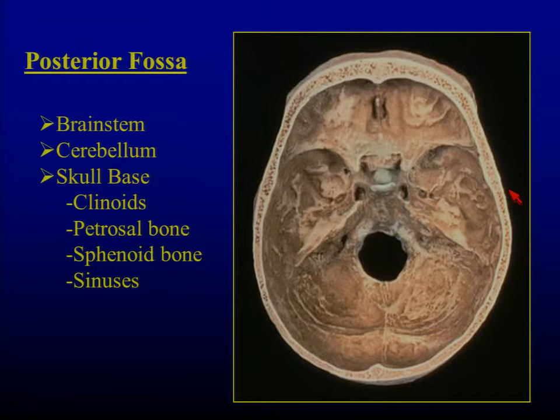So standard head CT, remember it's as if you're lying at the patient's feet, looking up at them. And as we look at head CTs, we can't just jump right in and look at pathology till we remind ourselves of a little bit of normal neuroanatomy, which we'll call the painful part of the lecture, where we just review the stuff that we used to know.